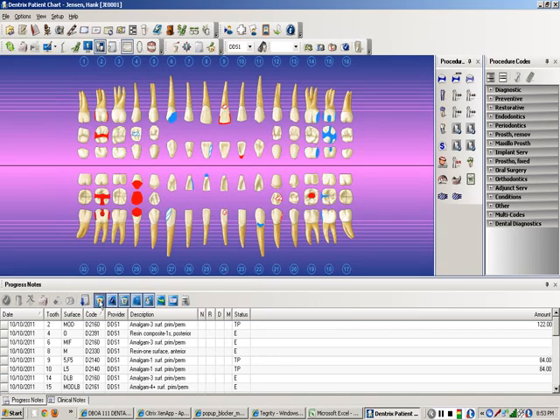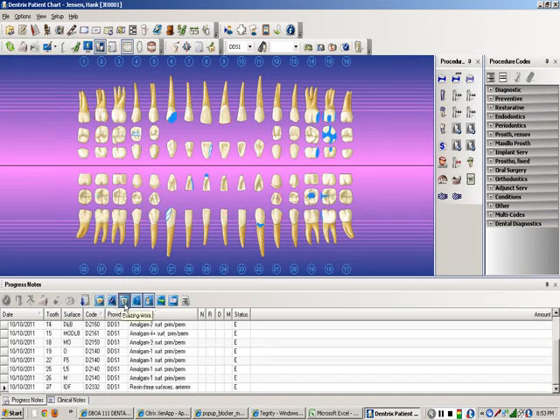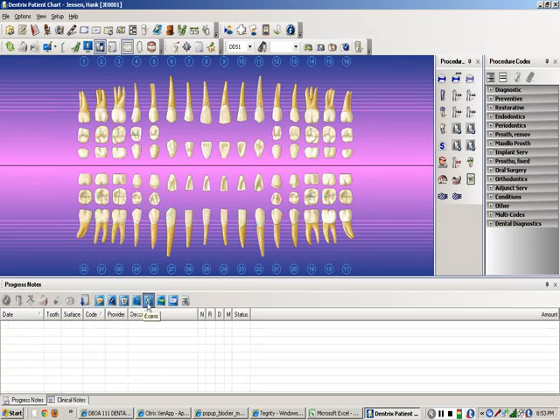So I'm going to go ahead and click on these, and as I click them, you'll see the picture frame go away. You'll also see a lot of your details go away. All the markings that you put on there are now gone. All the progress notes that you had down here are gone.